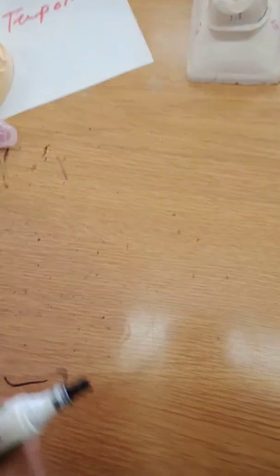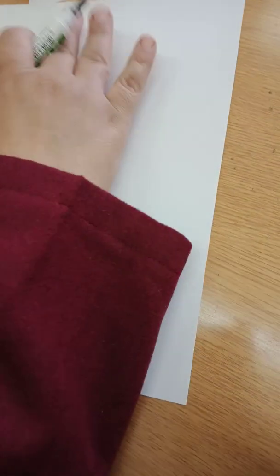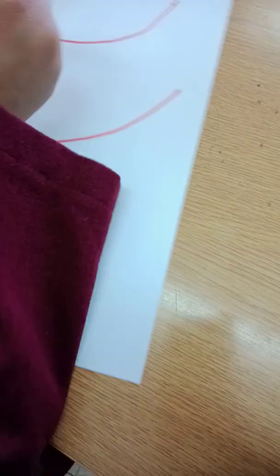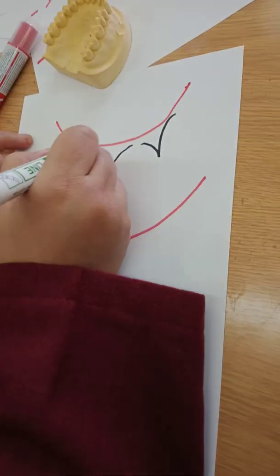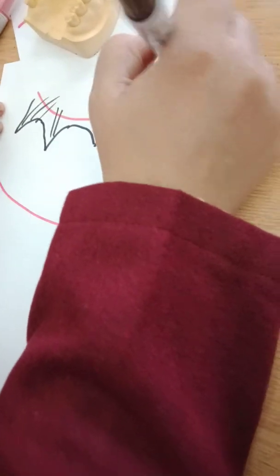The second index is for mock-up, and this is the index that we use with the rubber putty and wash. So this is the index there. This is the labial surface of the index. The index is like a big, huge lump of rubber placed over the anterior teeth. We don't leave it as a lump like this. We begin opening it as grooves, and slots running through the material. These slots run through the material to the palatal side.